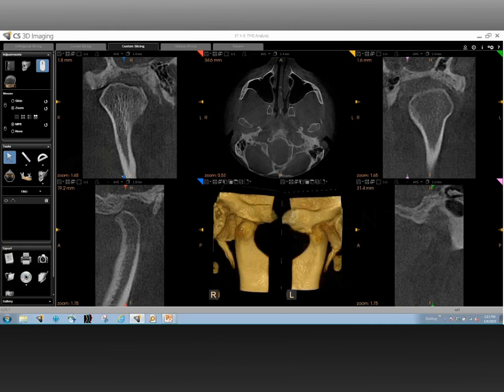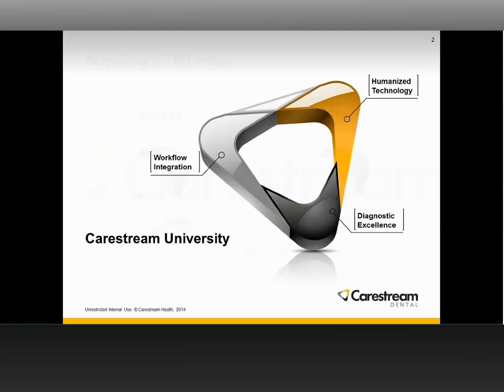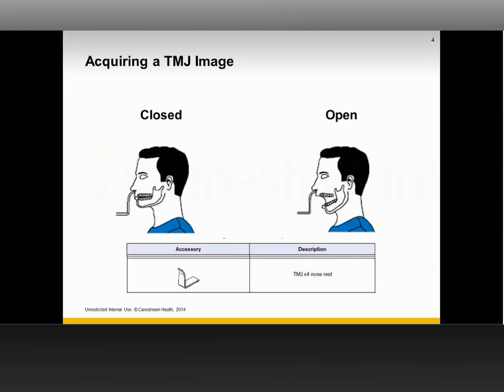Absolutely, and that is one of the big advantages of CBCT. It is possible to do an open view, and one of the reasons that an open view is done is to understand the translation of the condyle from the closed position to the open position. One of the big advantages of having a fast scan mode is that you can keep the patient's mouth open for less duration, do a fast scan, thus avoiding any other issues, and even patient fatigue between doing two scans. So to answer your question, it is absolutely possible.